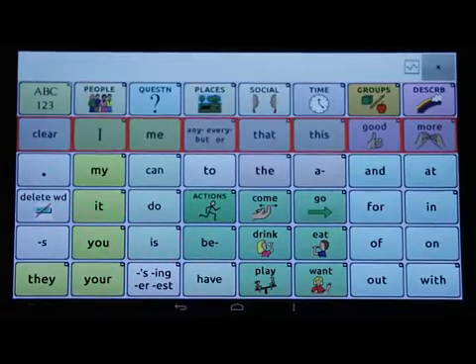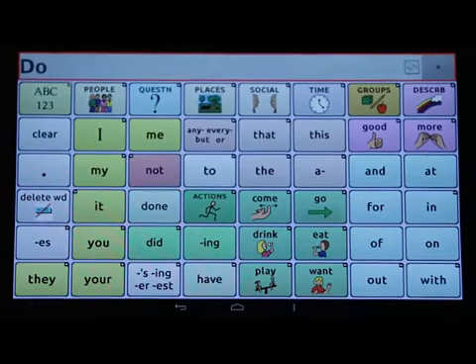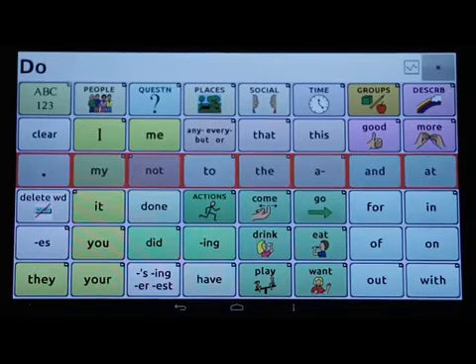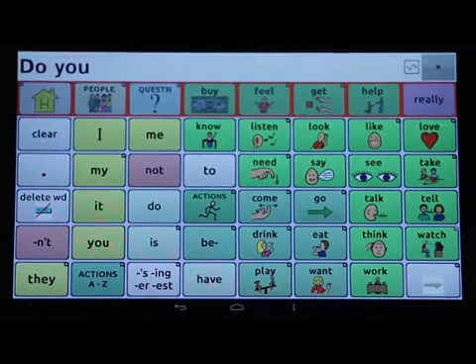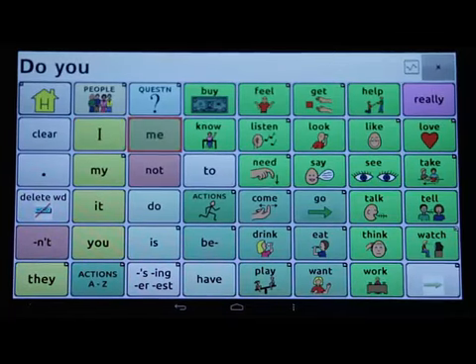I can add translucent overlay along with the outline option. The entire scan pattern is highlighted in a thin layer of color. This might be a nice option with WordPower because it's such a colorful vocabulary. You can also adjust the degree or percentage opacity as well as the color of the overlay. I will go with the defaults.